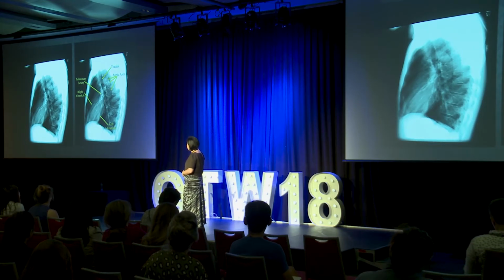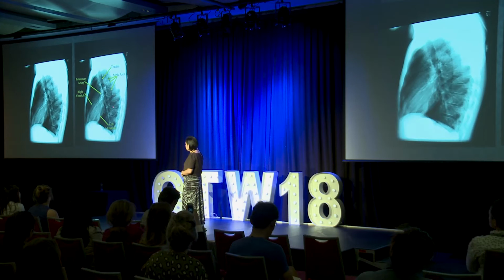Also, the other place you should look at is the spine. You get limited views of the thoracic spine, but because the lower lobes are bigger, there's usually more air in the lower lobes, so you should actually see the spine getting blacker, or there's less white, as you go down the thoracic spine on lateral projection. If the spine is actually getting whiter as you go down, then it suggests there's lower lobe pathology on either side. So then you go back to your frontal and work out which side it is.